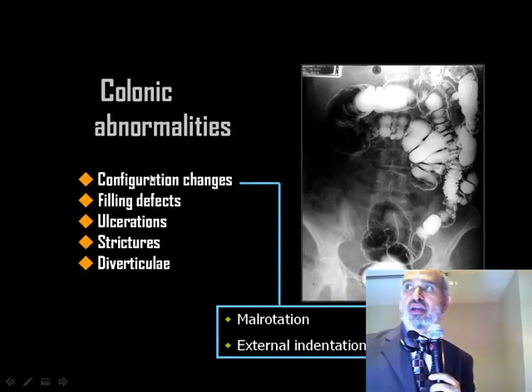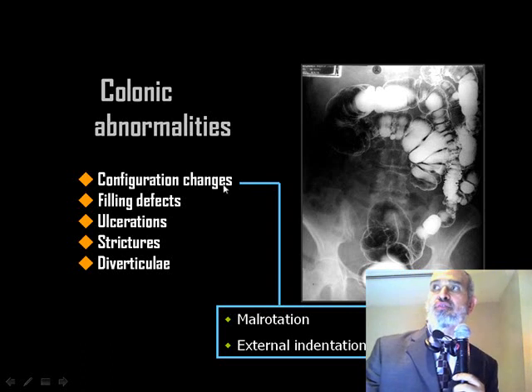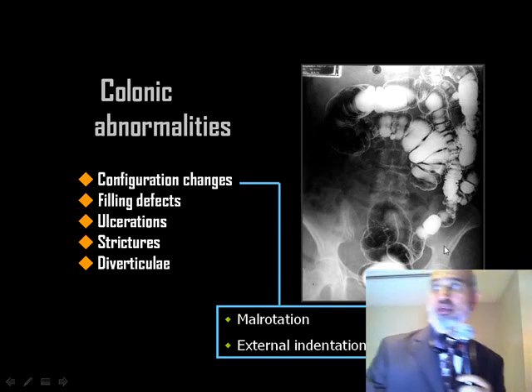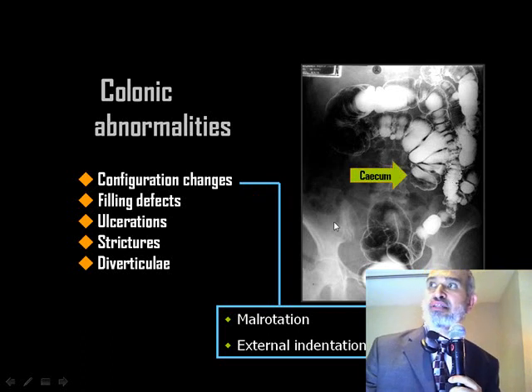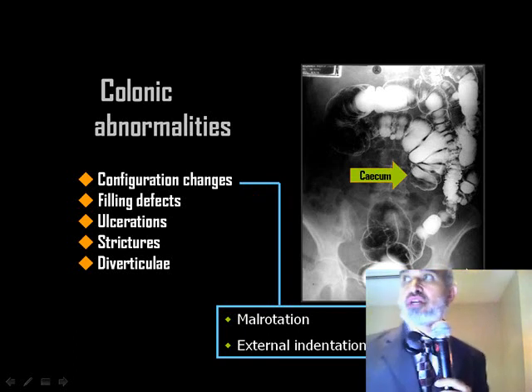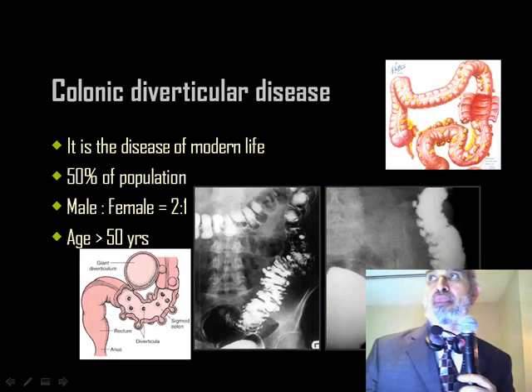The first is configurational changes, and you know that malrotation is also one of the common causes in the colon. And here you can see the cecum, instead of being here, is now in the left lumbar region. And this is malrotation of the cecum.